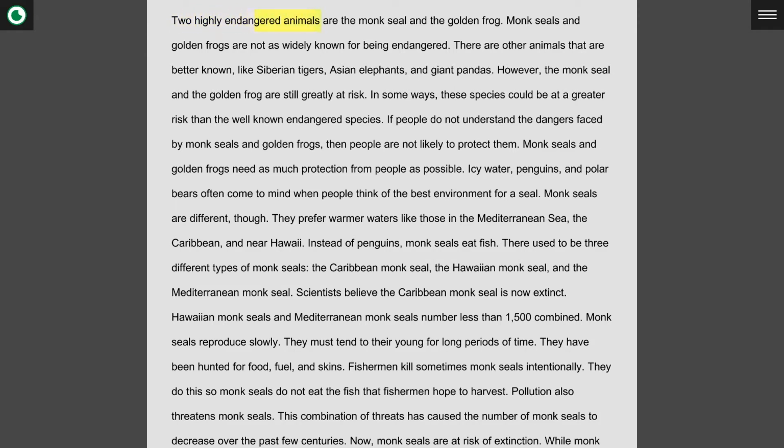What's going to happen is we're going to have a yellow box that you're going to follow with your eyes. And if you notice, if I lag behind, there's an audio feedback. And if I go too fast, there's also feedback. But if I'm staring straight at the box and reading at that speed that we typed in, then there's no buzzing feedback for you. The objective is to essentially train the user to read at a certain pace. At the end of these passages, we'll give you a reading comprehension test to test on your comprehension. And we'll also score you on how well you kept up with the yellow box.